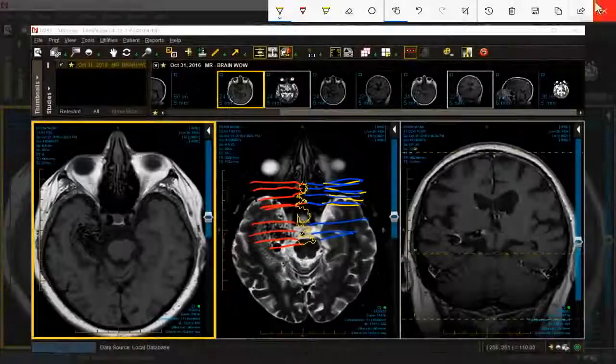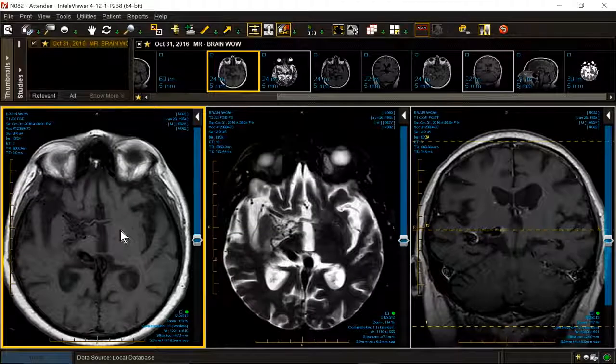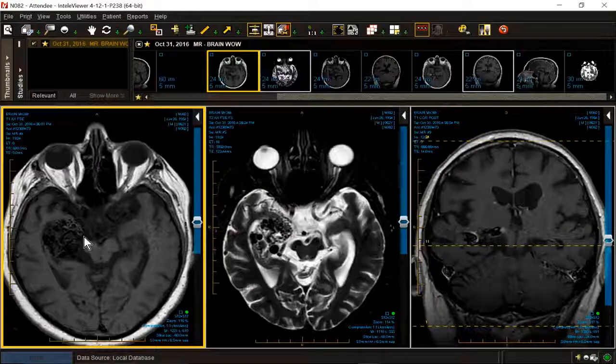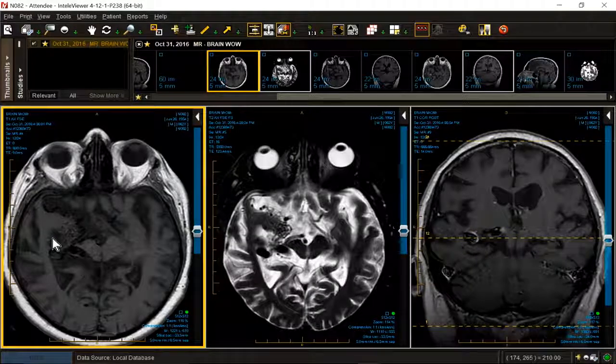If we go back and scroll this one, while it strictly does not involve those structures, you can see a little bit of brainstem involvement, some subfrontal involvement, but it involves the entirety of the hippocampus and part of the parahippocampal formation.